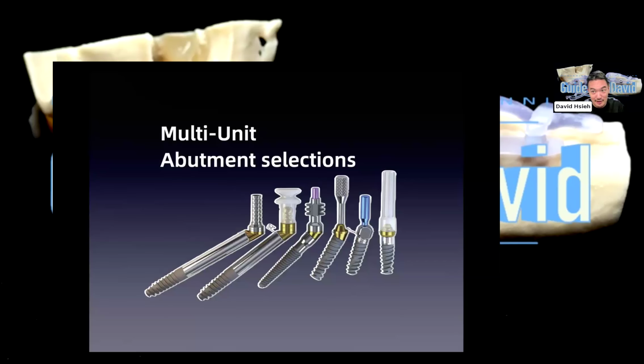So now we know we still have the multi-unit abutment, right? What the multi-unit abutment does when it comes to the full-arch fixed prosthesis, the first thing is, it changes the internal connection into an external connection. So it allows different units to fit, the prosthesis seated down at the same time, like a greater path of insertion, per se, right?